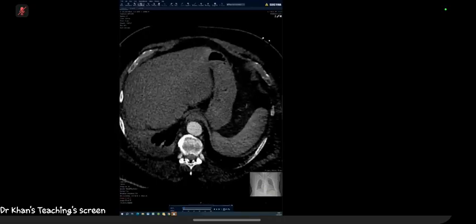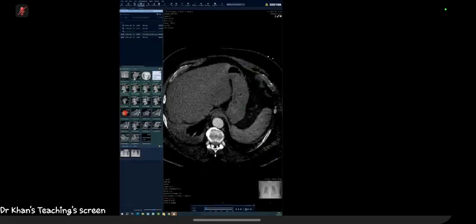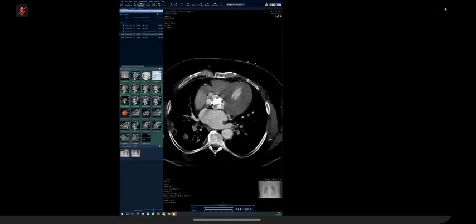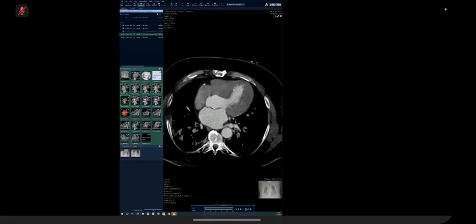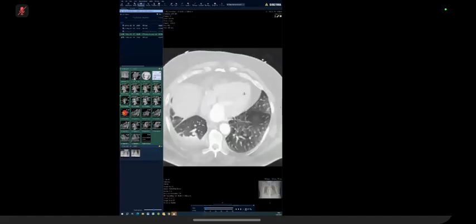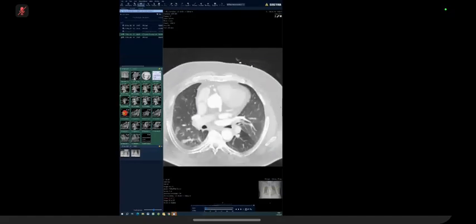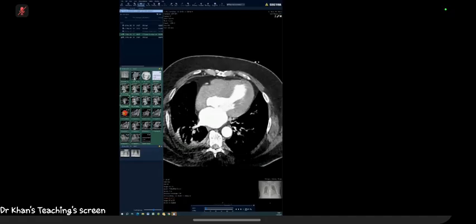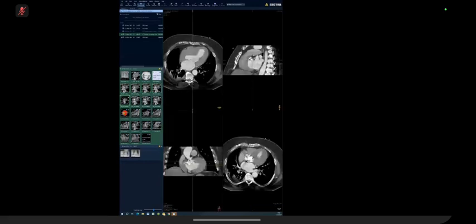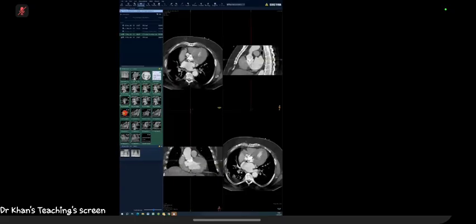So one thing to remember is somebody gave you a cardiac case, we must be doing well. And I'm going to give you another reformat to see how you do with that. So I told you the patient has an aortic valve replacement, and the patient has an abnormal echo and is in heart failure. You see the heart failure changes with a bit of pleural effusion and some septal thickening. So focus on the heart. There is left ventricular hypertrophy. The patient would have that anyway if they had aortic valve disease that was subsequently treated.